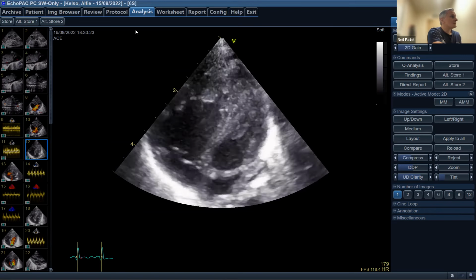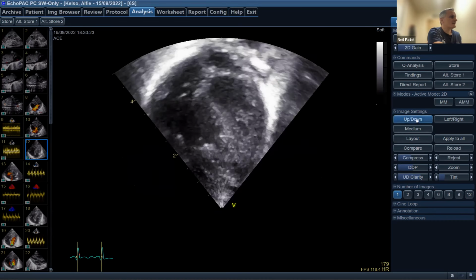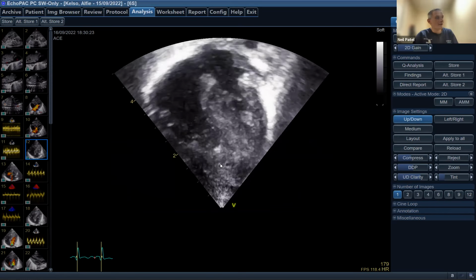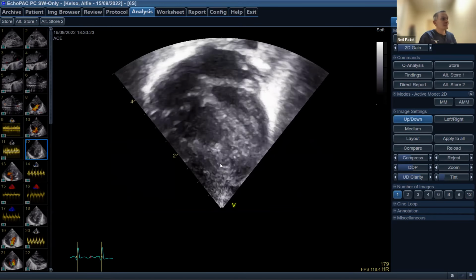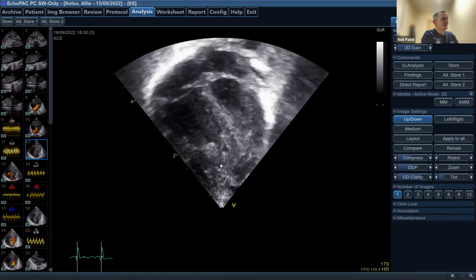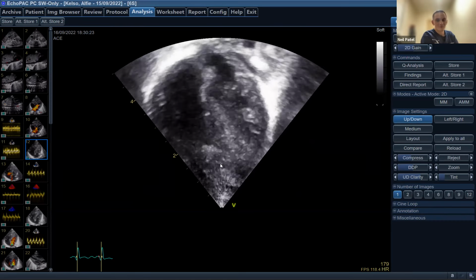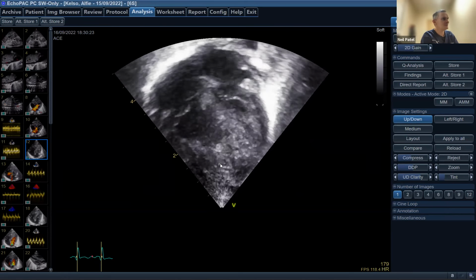This is an apical view. Apologies, I still tend to look at these as an inverted image. I can turn that up the other way for you all. So, slightly dilated right ventricle here. Now, I suppose an important point is interpretation of function from 2D loops. Although it is subjective, it is arguably a standard of functional assessment. If you ask the cardiologists to come and assess a baby, they will predominantly, historically, base their functional assessment on their experienced expert interpretation of the 2D images.